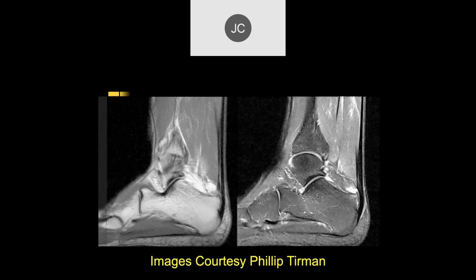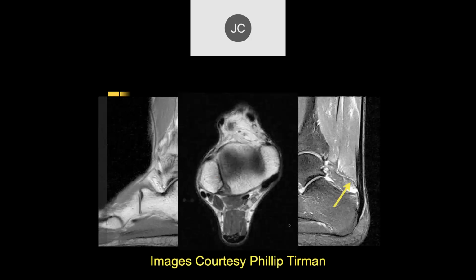Okay, Tayson. All right. So I see some retrocalcaneal bursal fluid, and there is a muscle kind of low lying towards the insertion of the Achilles tendon. Look here, there's this tendon here. So maybe an accessory soleus. Okay. And on the axial, where you should have this peritenon fat, we're seeing muscle there instead.